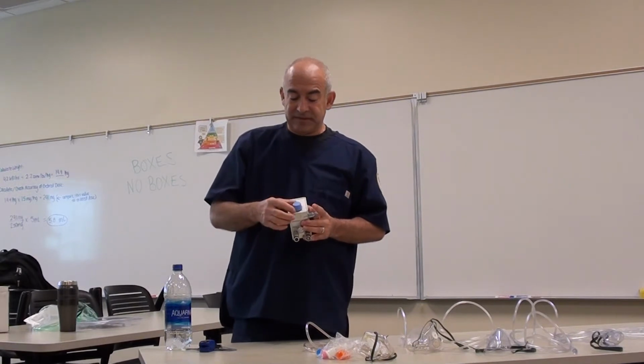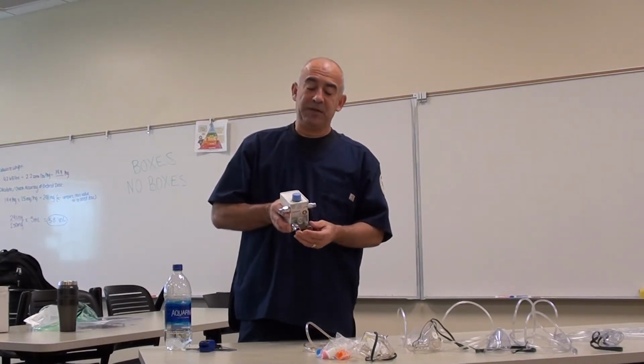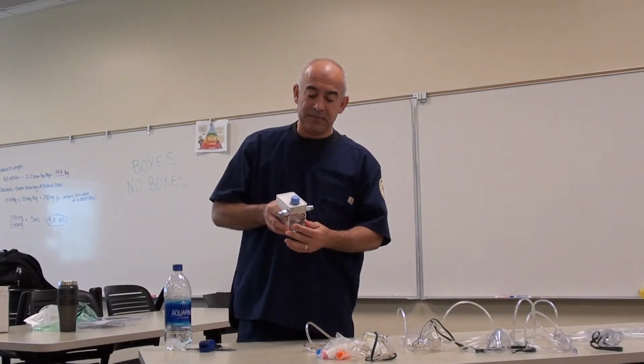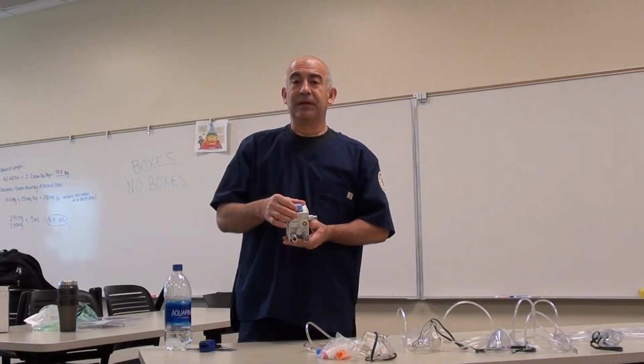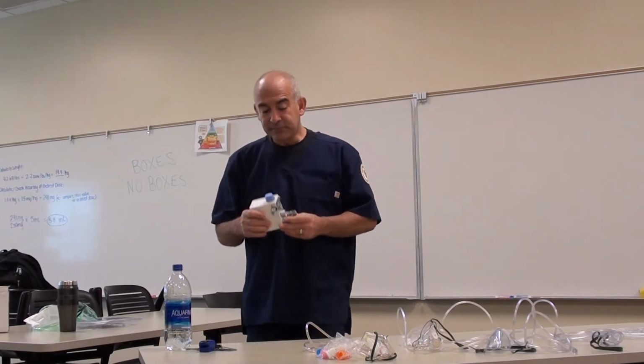A disadvantage of this particular device is that it does require 50 PSI delivery into the device for it to work, and that sometimes it is unreliable as far as the accuracy goes, and can fail.